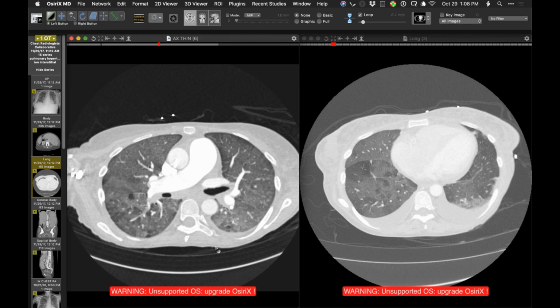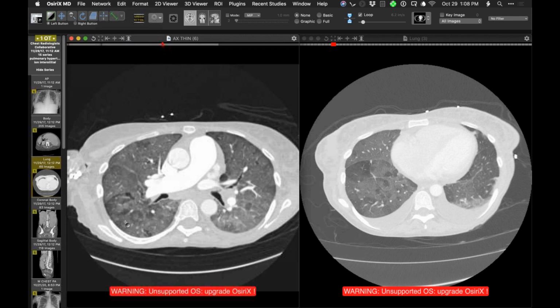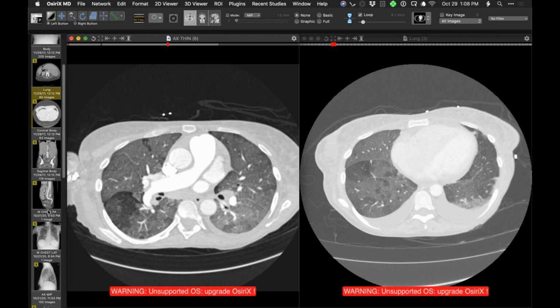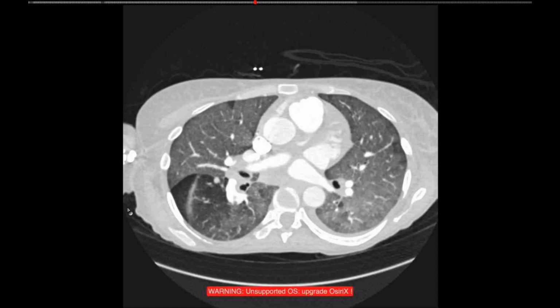And when I looked up the medical record and saw that the patient had chronic polycythemia vera, then I intuited that I know what this is for sure, pretty much, which is diffuse extramedullary pulmonary hematopoiesis.